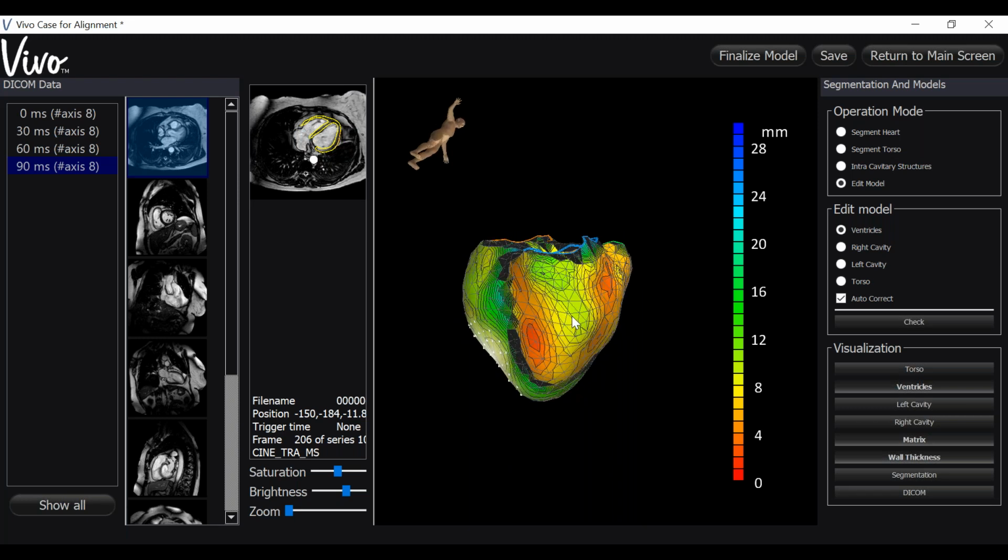Now I'm going to look at the right ventricle. Just as you did over there, you're going to Control and left click on the area you want. To make it smaller, now you're going to hit Shift and Control wheel back, or scroll wheel back.